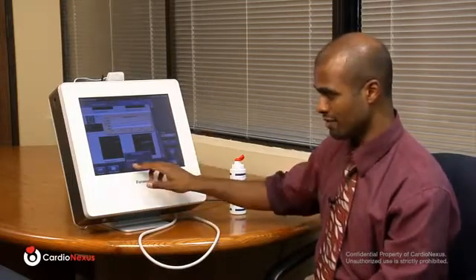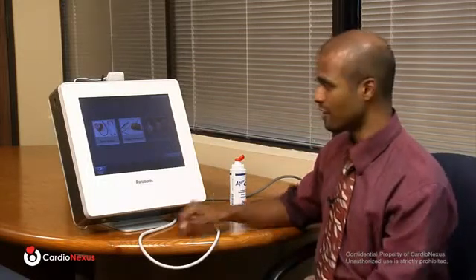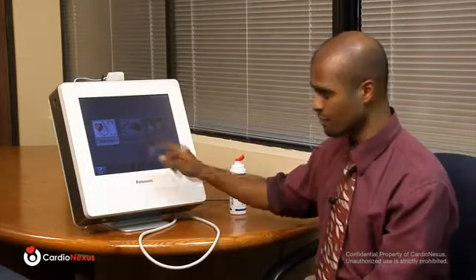Simply pressing End Study will prompt you, do you want to end the study? Pressing yes will bring you right back to the main menu. This is the point where we started. Now I'll show you how to review that record simply by choosing the Study Records button.